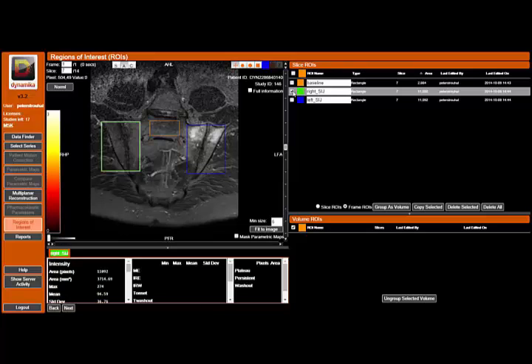The software effectively uses the baseline to produce a surrogate imaging biomarker within each region of interest, focusing on the size and intensity of the voxels within it, and therefore providing information on the intensity of each voxel and any lesion within each region of interest.